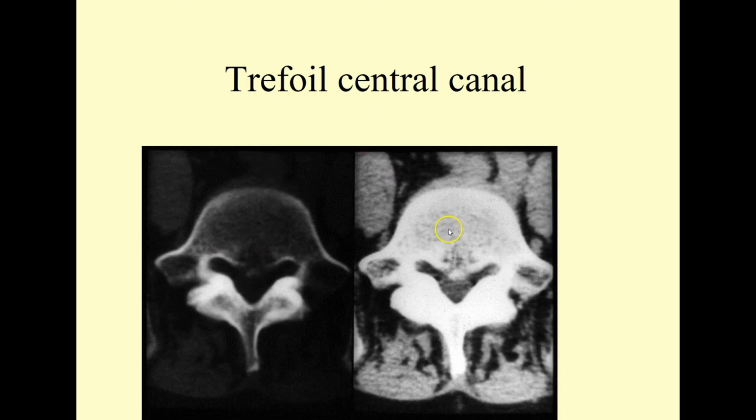Now, this is the same vertebral level. This is a CT image, fine bone. Look at the outer layers, clearly white, so we're looking at a CT. The volume we have here on this bone window versus what we see here again relates back to what I was saying before, that in the bone window, we can't appreciate the joint capsule. On the soft tissue window, we appreciate the joint capsule, and that's what further narrows this.